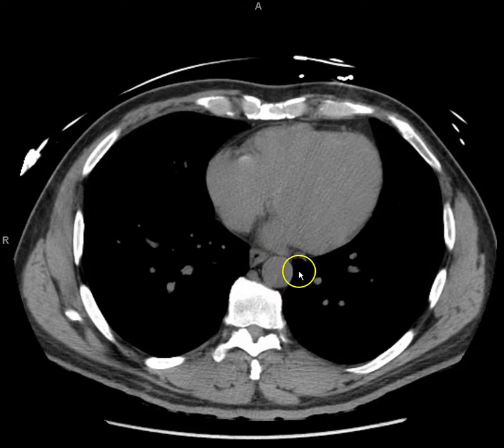What is this? Aorta. Descending what? Descending thoracic. Yeah, good. We're at the level of the heart, so the vena cava is inferior to the heart, right? Pulmonary. It's got air in it, no? Esophagus.